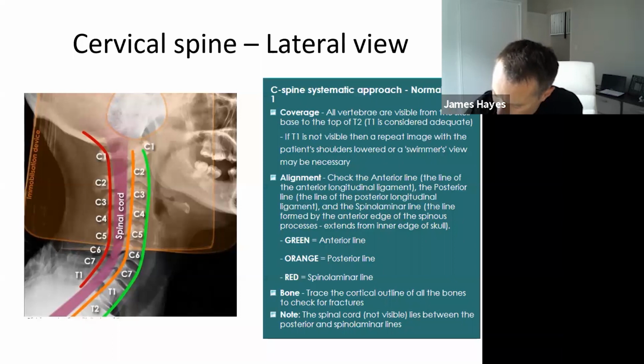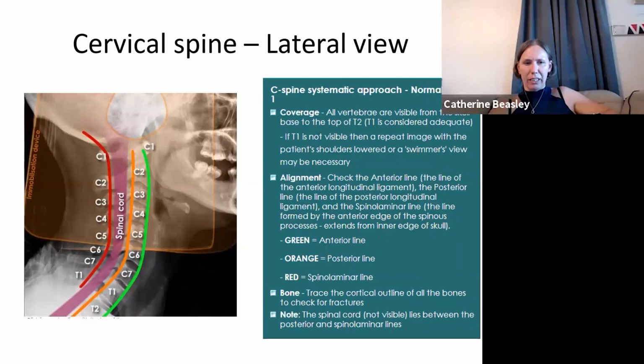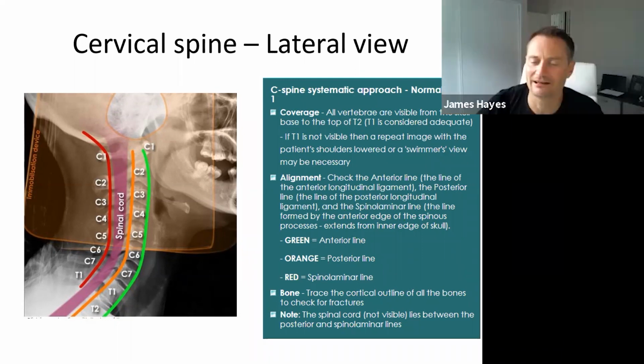Rheumatoid arthritis. You asked about one of the lateral ankle, which was one of your earlier ones. Have you had a picture of that without the red line on it? Yeah, don't worry. I thought of that at about 6:30 today.